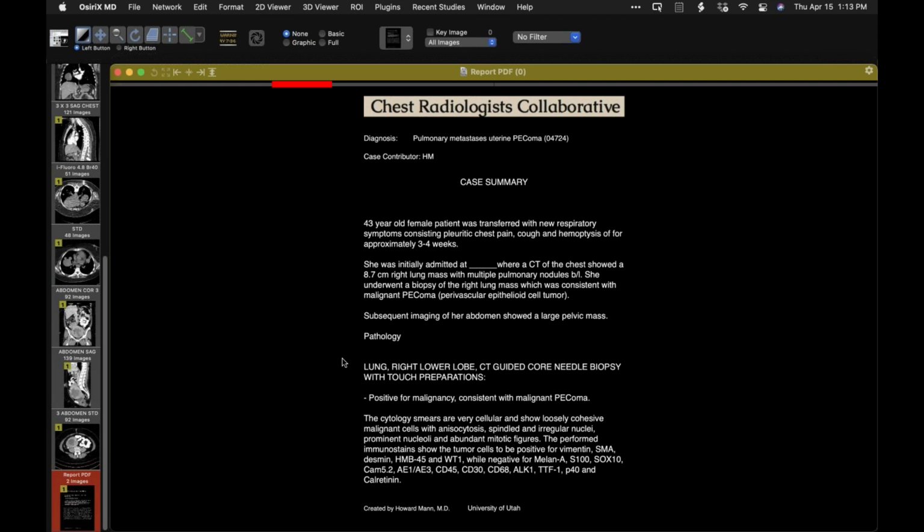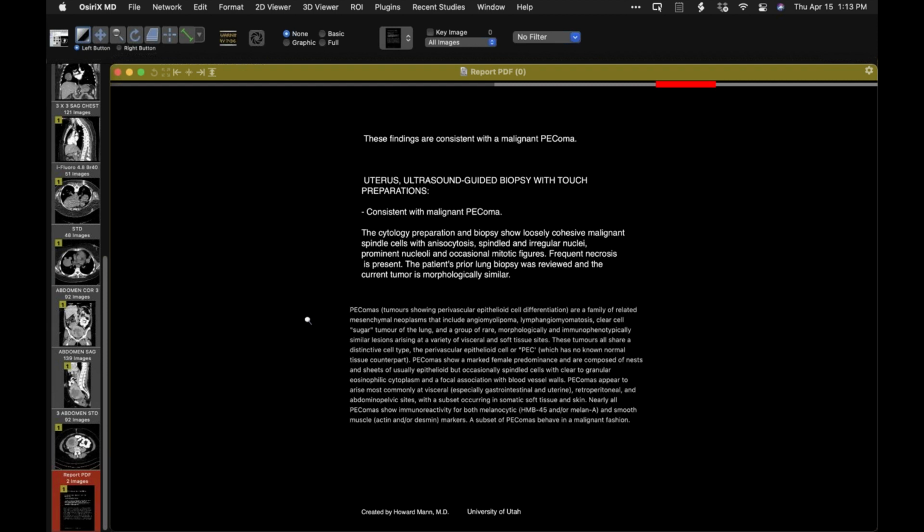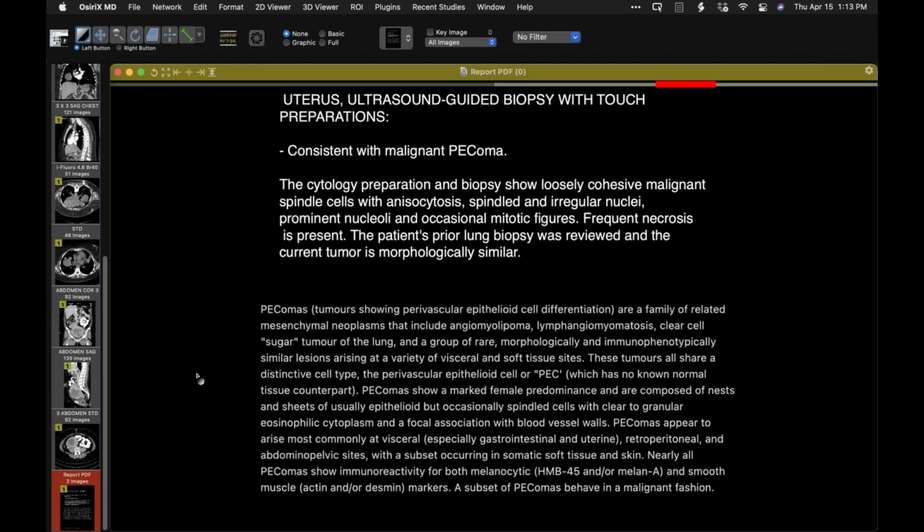Let me show you what the interior of these look like. The areas of low attenuation within are quite striking, presumably foci of spontaneous tumor-associated necrosis. So of course, the question is, what is the cancer? If we get a history of uterine cancer, we would think, okay, uterine sarcoma should be first: nodules, different sizes, cavitation, that would be fine.